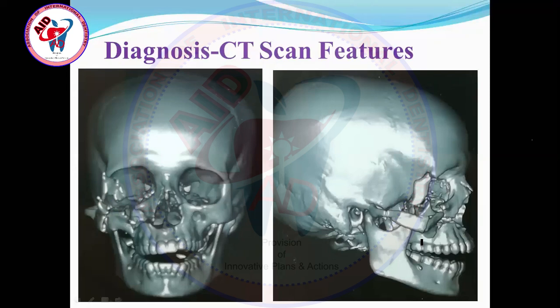The same patient from the lateral aspect, you can appreciate the zygomatic arch fracture, which I was describing here, that there could be some posterior fracture also. Look here on the arch, there is a triple fracture of the arch and a comminuted fracture of the body of the zygomatic bone. At the frontozygomatic suture, look here, the lateral orbital rim and wall are fractured, and the body of the zygoma has multiple comminuted fractures. Then coming towards the arch, at the junction of body and arch there is a fracture, and a triple fracture of the arch is also there.